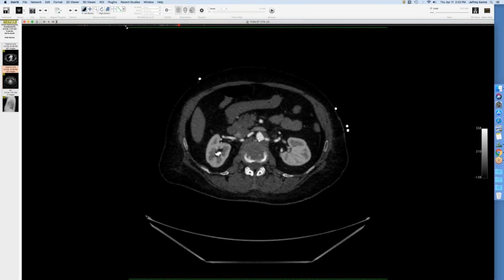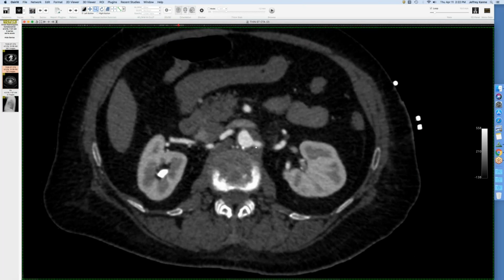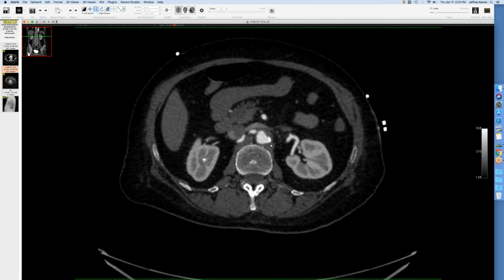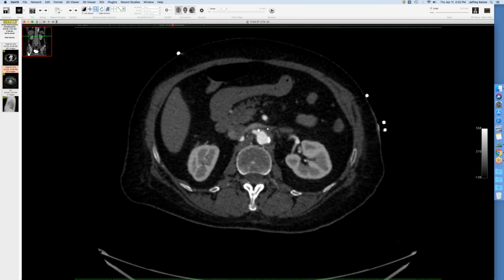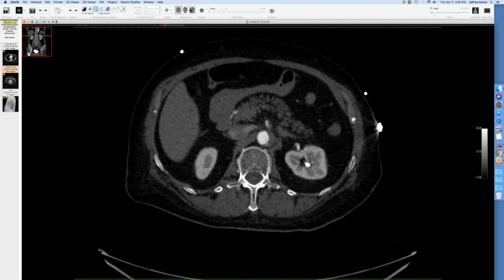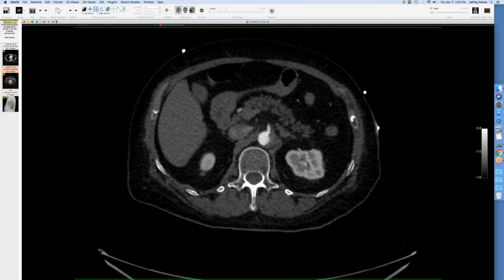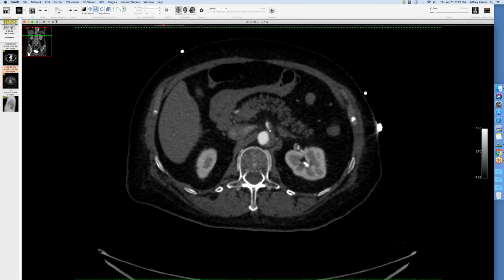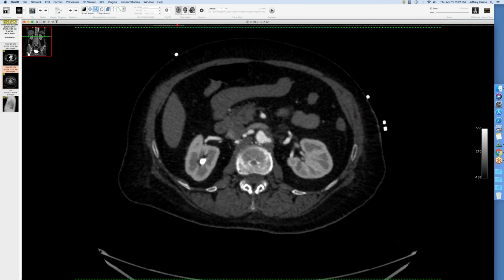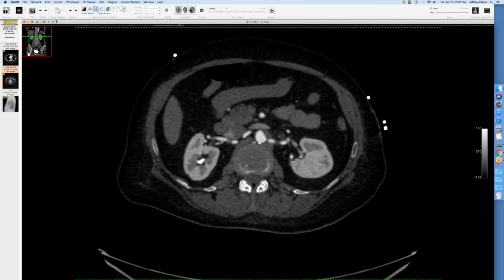So the left renal artery here comes off the true lumen, but you can see it passes through the false lumen. And I'm just trying to figure out how to reconcile that. If this is truly a dissection, unless, because the renal artery is not involved as far as I can tell, but you see the flap extends into the superior mesenteric artery right there, and it gets pretty narrowed. But how does the left renal come off the true lumen and pass through the false lumen without the dissection involving the renal artery itself? So let me make a coronal of this.